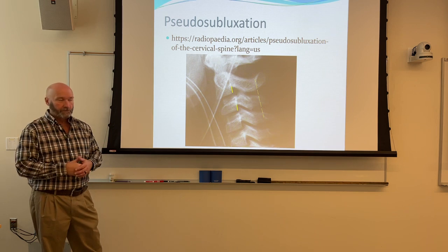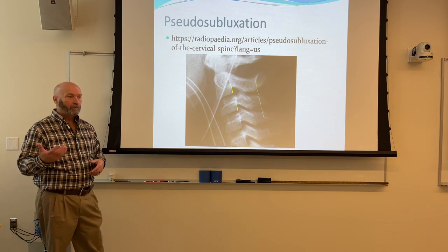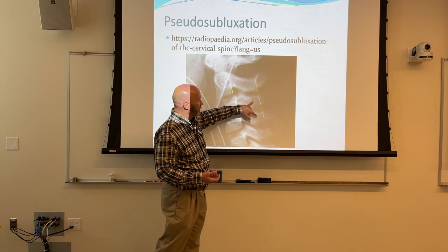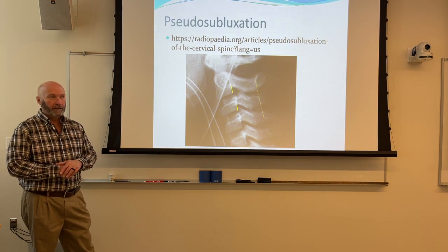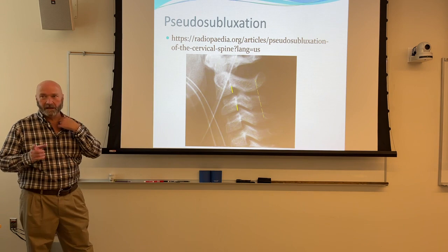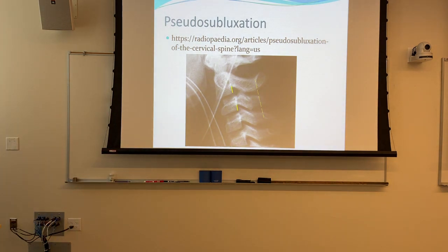Okay, now you're truly into a 2-view. Certainly, what you would want to do is have the patient do their flexion extension and not try to talk them into anything more than what they could do. But with the flexion extension, what you should see is a little bit more movement or dissimilarity on the posterior alignment that would indicate true subluxation as opposed to pseudosubluxation. Okay. I've never seen a situation where I got a kid up, did flex-extension views, that it was not pseudosubluxation. So it's not like you're going to be called on to do that with every kid that comes to the ER. Just if it has that appearance and they're clinically sound, you might be asked to.